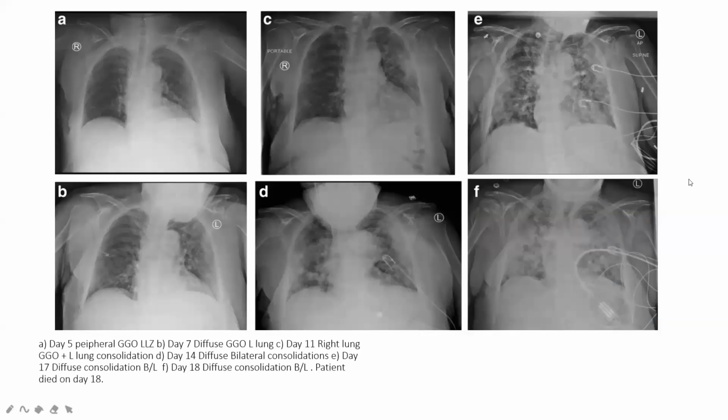So this is a case of a patient who unfortunately died of COVID. The picture on the top left side, picture A, is a chest X-ray on day 5, which I'm not sure if you can see, but there is a very small area of ground glass opacity in the left lower zone. It's very small, it's not that big. Picture B is day 7, which shows that the ground glass opacity has become more diffuse on the left side. But there is still no evidence of the disease on the right side.